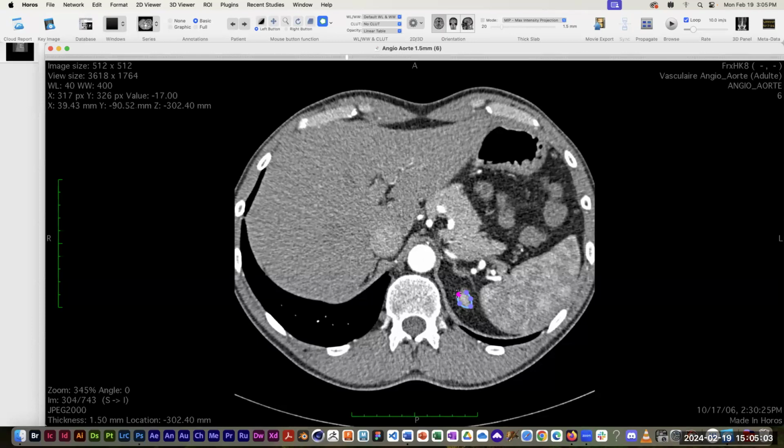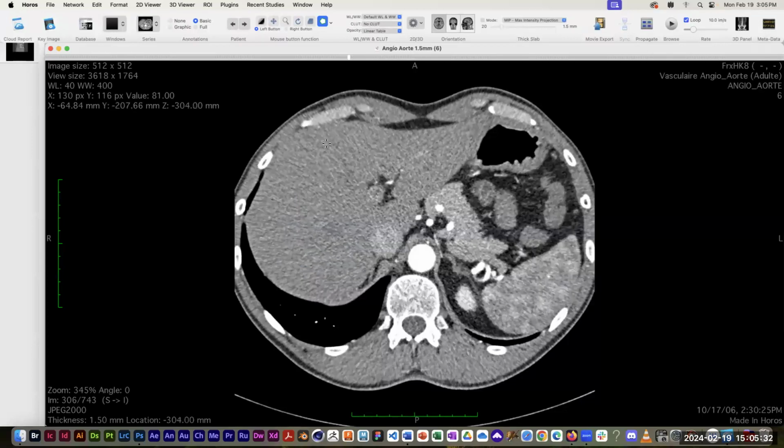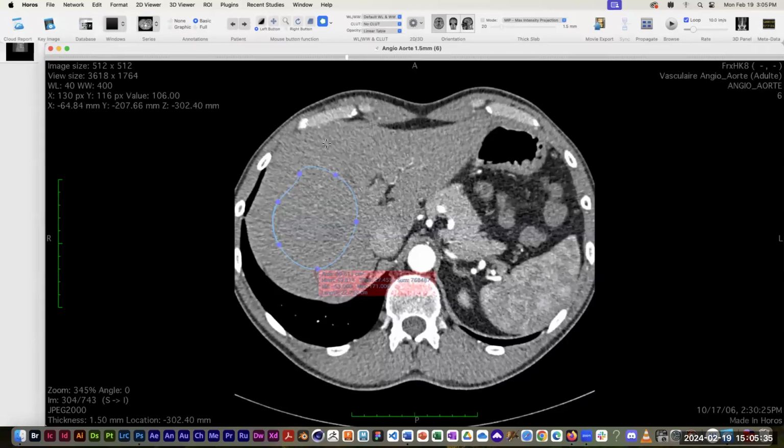It may be hard to see on this one. Tell you what, I'm just going to draw some big random thing here, just so you can see this better. So I'm drawing a series of straight segments. I'm just clicking, and it's kind of guessing the curvature for me. And I come up here and the temptation is to come back to the starting point and click. And it looks fine right now, except if I scroll ahead a few slices and then come back to it, look what it did. It put a weird little kink in the line. So you actually have to resist that temptation to click on the starting point.